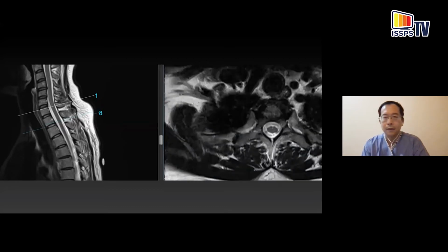This is at T2, upper T2 level. You can see the transverse process. So the transverse processes are hinged on the upper aspect of the vertebral body. Don't forget. This is a well-defined costotransverse joint. This is at T2 level, costovertebral joint, transverse process, lamina, spinous process.